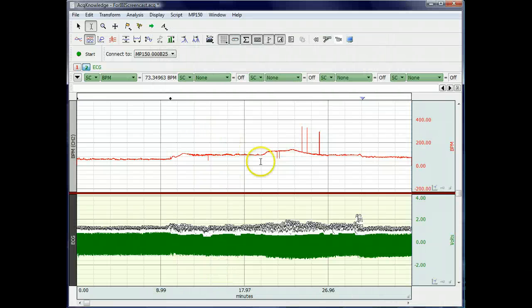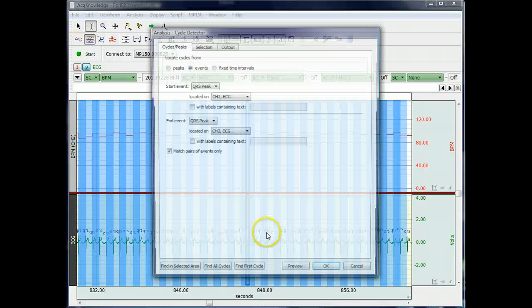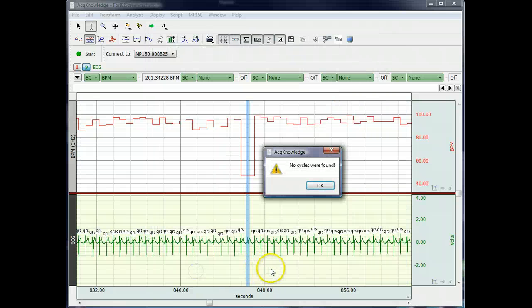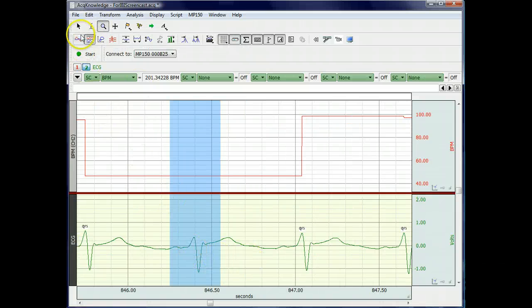And see, it wasn't perfect, but there's only a few now. Next iteration, okay, we missed one there. Oh, wait, no. Let's see. I think my threshold was too high.